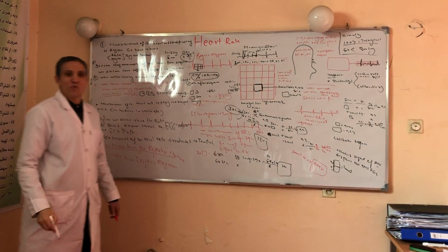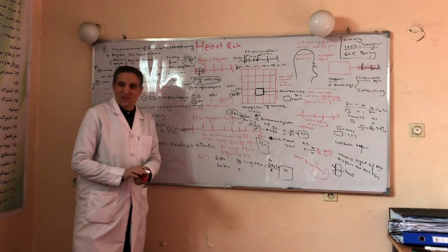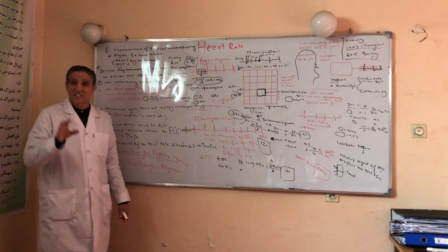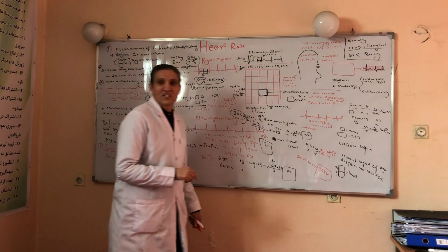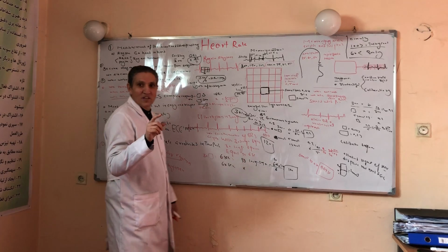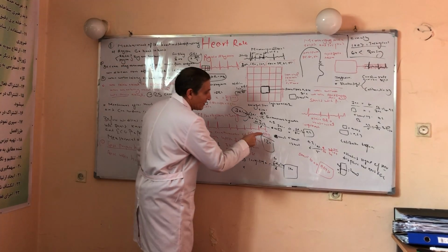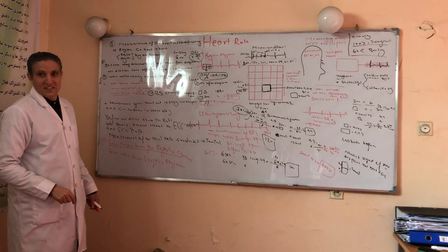This was about the case where the rhythm is irregular. So if the rhythm is irregular, for example, a patient has atrial fibrillation, we measure the number of QRS complexes over 30 large squares. Since we know 30 large squares equal 6 seconds, and in the 6 seconds we have 12 QRS complexes, in 60 seconds, X, we have a rate of 120.